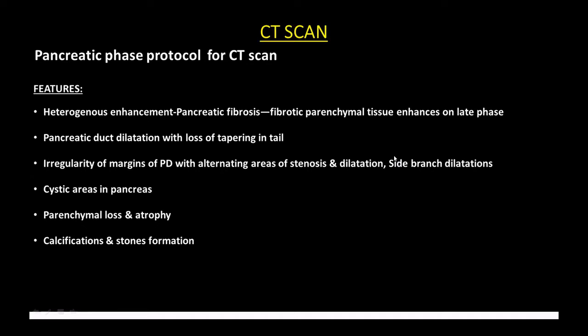Now moving to the CT scan, it is the most important modality for the evaluation of chronic pancreatitis. In each and every patient in whom chronic pancreatitis is suspected, he should be subjected to the CT scan. It serves as a baseline investigation for future investigations, as well as for comparison and progression of the disease. So we are doing a dedicated pancreatic phase protocol for the CT scan.